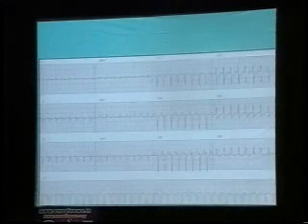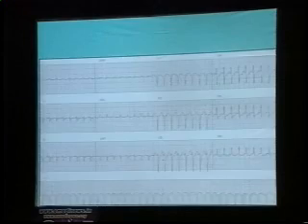Okay, let's move forward now. Is the ECG clear on the back, please? Yes? Are you able to perceive the ECG right? No, yes. If no, please, there are a lot of seats in the front. You can just move forward. Because I'm sorry, I can't improve the quality of the ECG at the moment. I'm sorry.